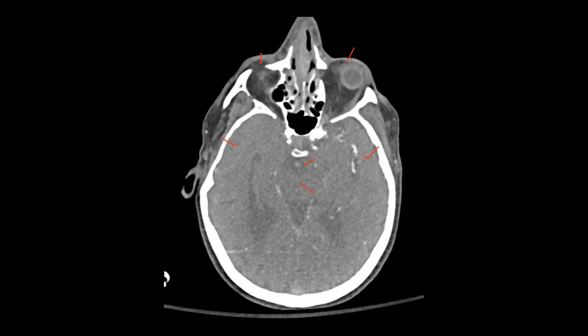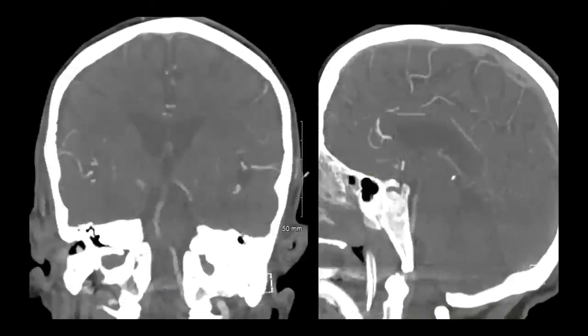Basilar. Vertebrobasilar artery. So when you see the contrast enhancement in the ICA, you see it in the MCA, but here it's not as good. So that should raise a red flag. So I'm thinking, oh, something is going on with the basilar artery. It's not totally disappeared, but it seems to have some kind of density within it. However, it's not fully enhancing. And then you get the other images to confirm. So if you don't really look, you might end up missing these things.